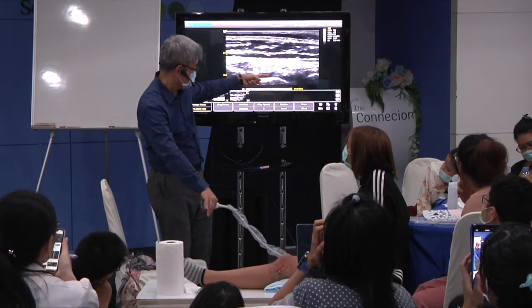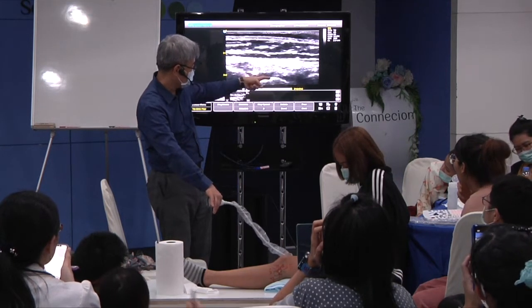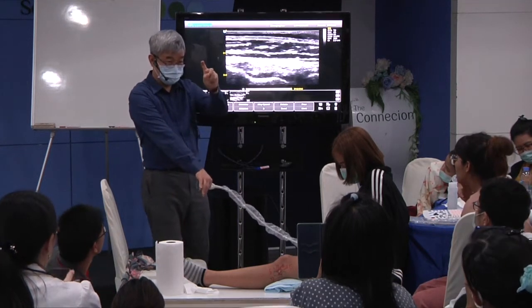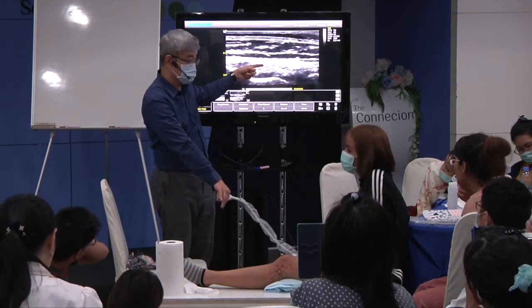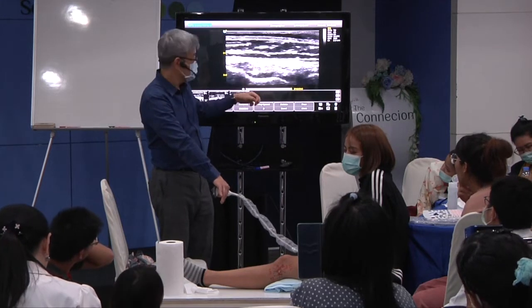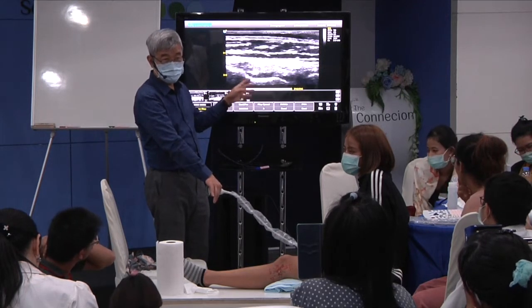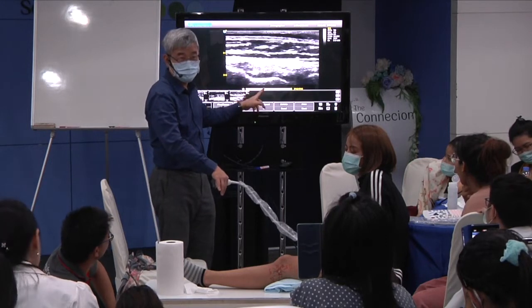First one, popliteus tendon. Second one, the dark tendon, the popliteus tendon, because it is curved. LCL is relatively straight, bright. Capsule. So, see, it's very easy. Two-second job, as long as you find the sulcus.